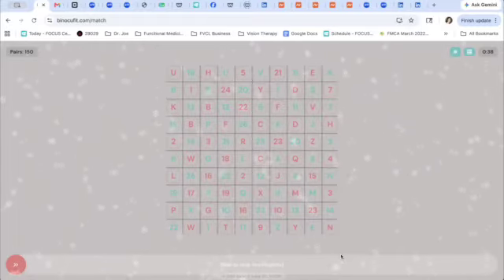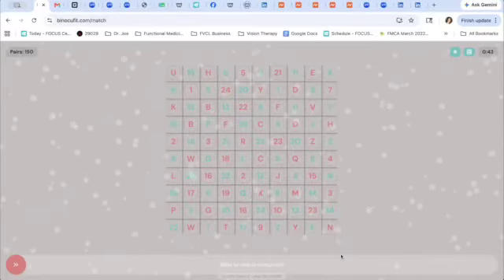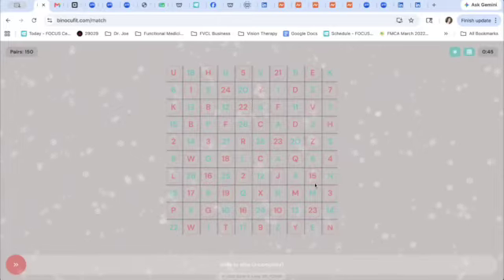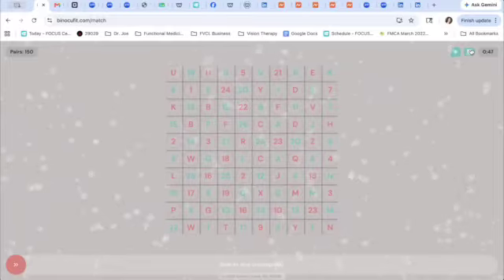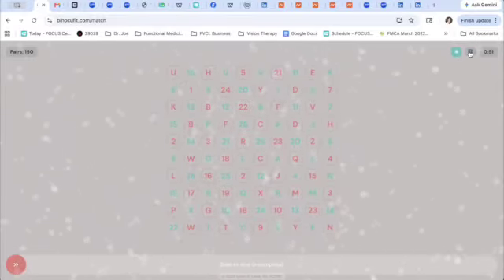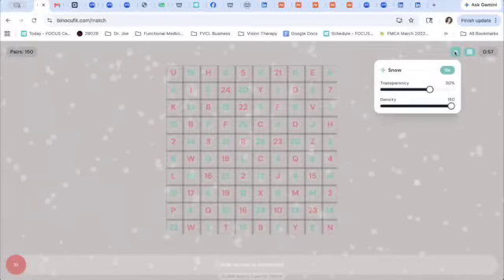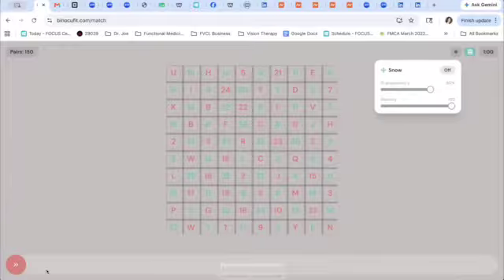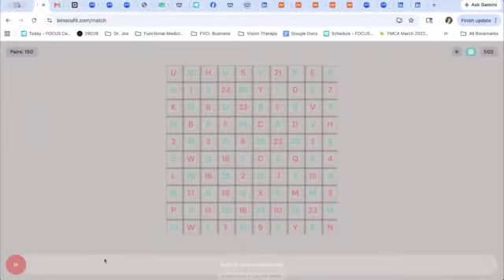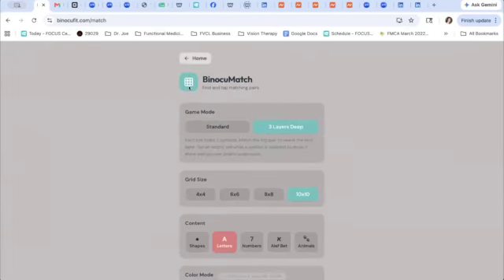So it's been helpful in that way when I know I need the cancellation to be perfect, where in some of the printed materials, it's challenging to make that happen. And again, I can turn that grid off, but I have not attempted to do this one without the grid, given that there's a reason I am a vision therapy doctor. It has to do with my own visual vision therapy needs. All right. So that's BinocuMatch.